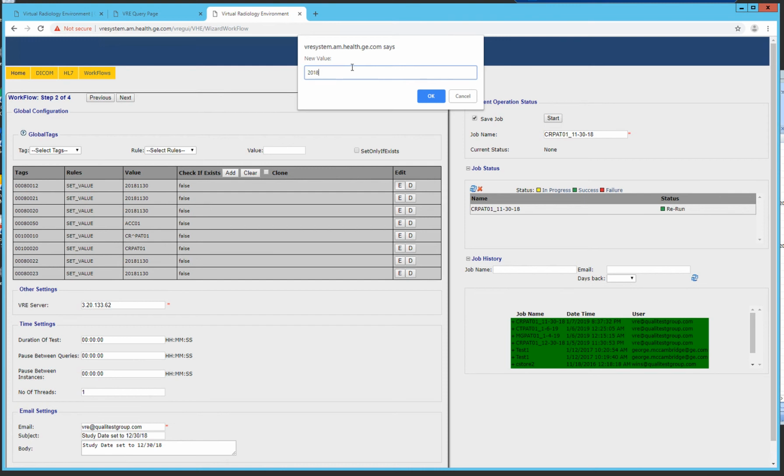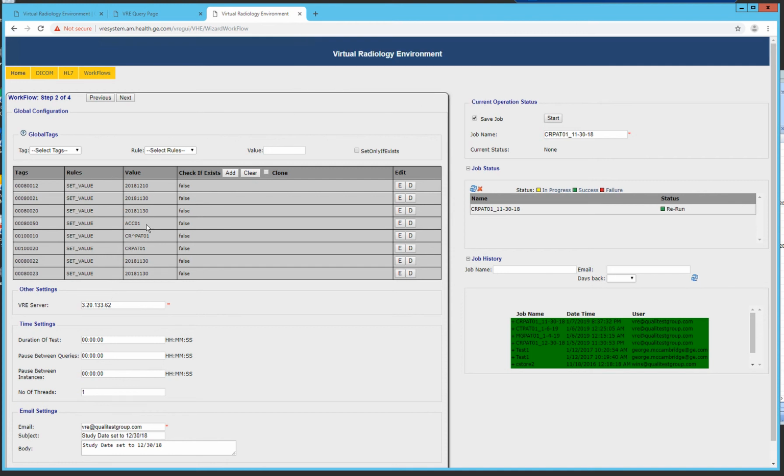So an example would be to set it to like 12:10. Okay, and then you would copy that across each of the DICOM tags here in the configuration, and then you would be able to basically have the same data with new UIDs, new identifiers, etc. Then you would update the session number to reflect as if it was a new study for the same patient, same ID, probably a new accession number, I'm assuming, and then a new date. And you could put the times in if you like as well, all from this simple interface.